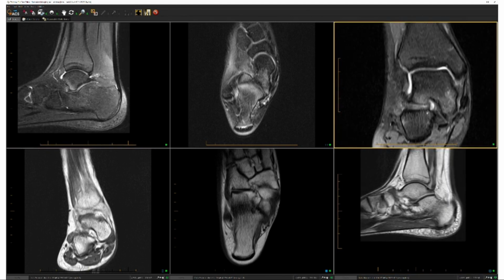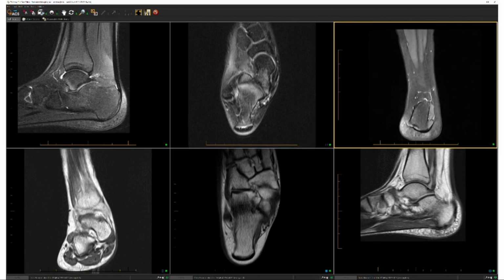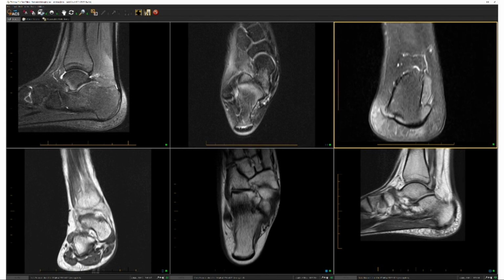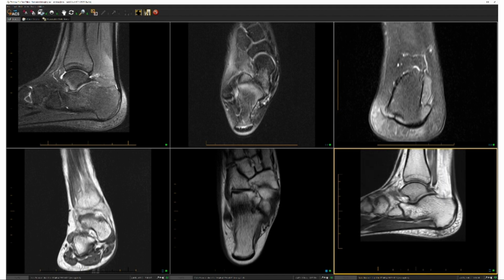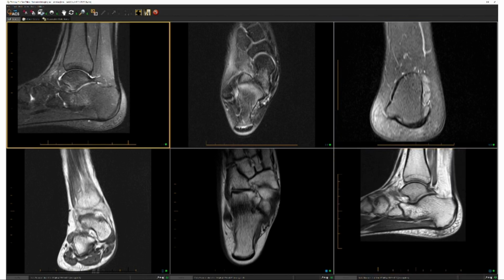I'm looking at the plantar fascia itself, and I want to understand very carefully, look at that central cord. We're seeing very early changes, even some skin subcutaneous change on T1 right at the central cord, telling me that this is where the patient has pressure points when they heel strike. So that's what that helps me with. I wouldn't go on to call it plantar fasciitis. I think it's telling us a biomechanical clue to how this person strikes the heel.